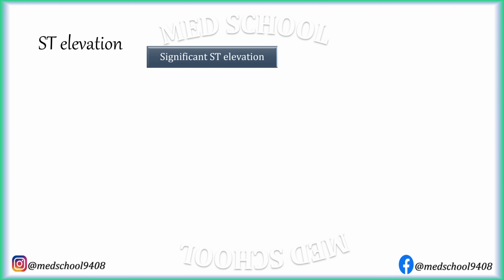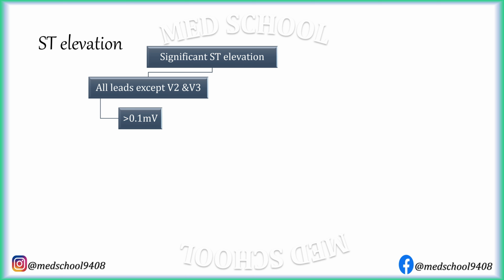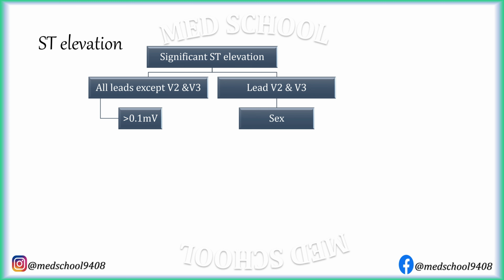Significance of ST elevation depends on which lead it is present in. In all leads except lead V2 and V3, ST elevation more than 1 mm or one small box is considered significant. For ST elevation in lead V2 and V3, sex of the patient is taken into consideration.